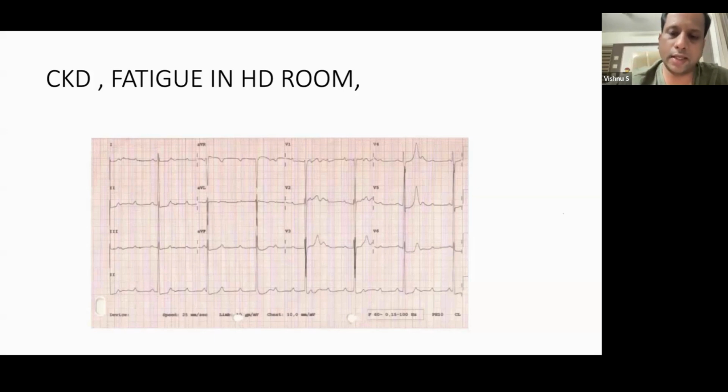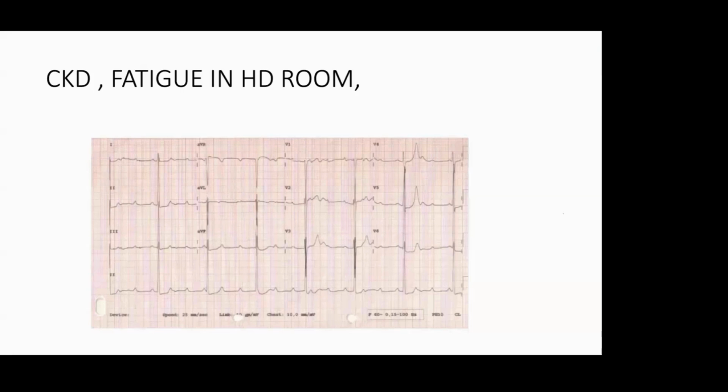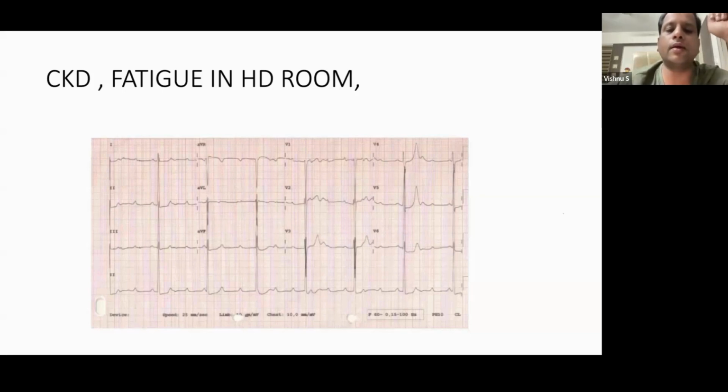Is it 2:1? Is it high grade, or is it... PP interval, RR interval, P2 AV relation, more P than R waves. Complete heart block. It's a complete heart block. Complete heart block with hyperkalemia.